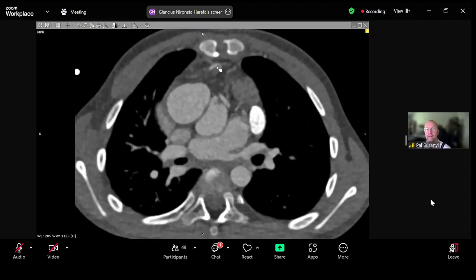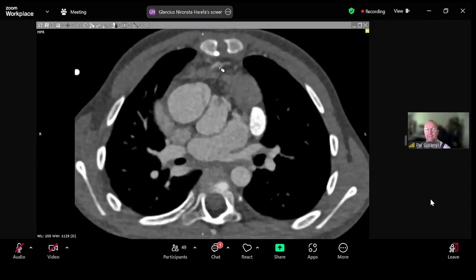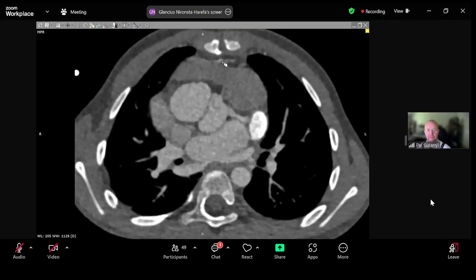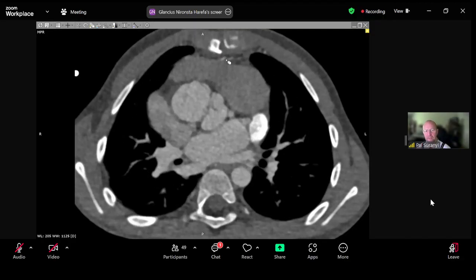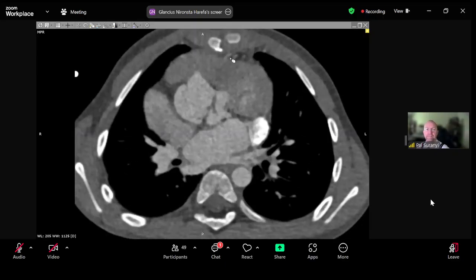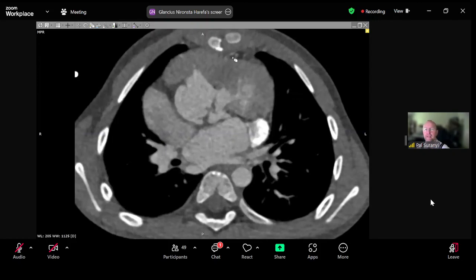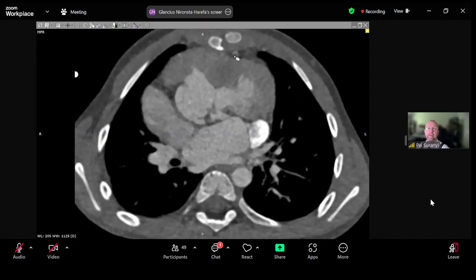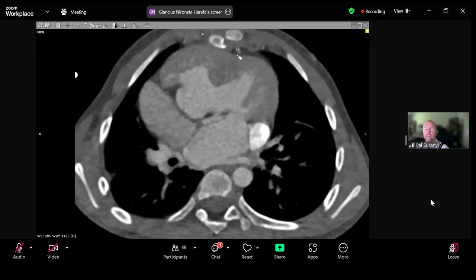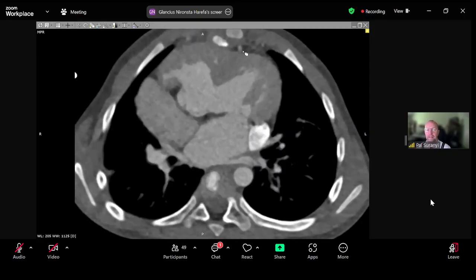And that goes parallel to that anterior interventricular vein. And then gives off branches to both ventricles. Excellent. That goes in the anterior interventricular groove. So everybody can see it now.